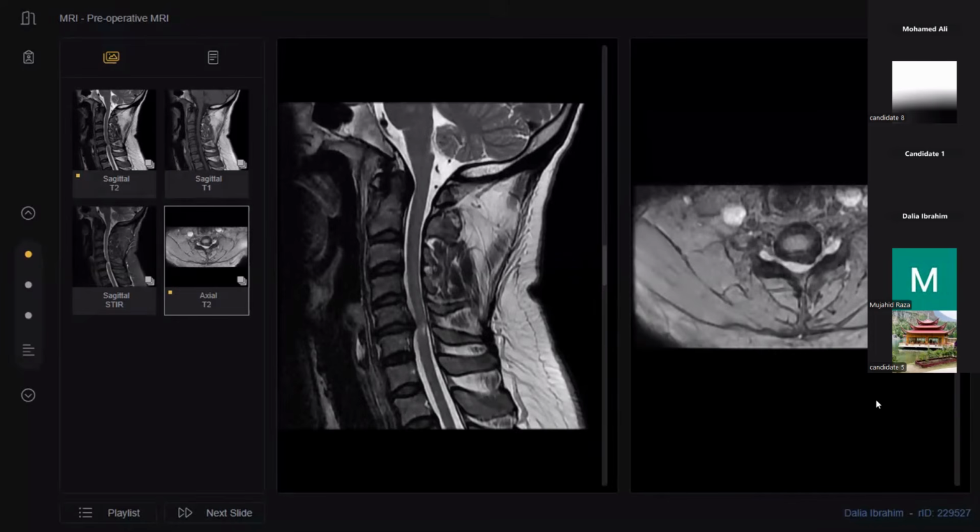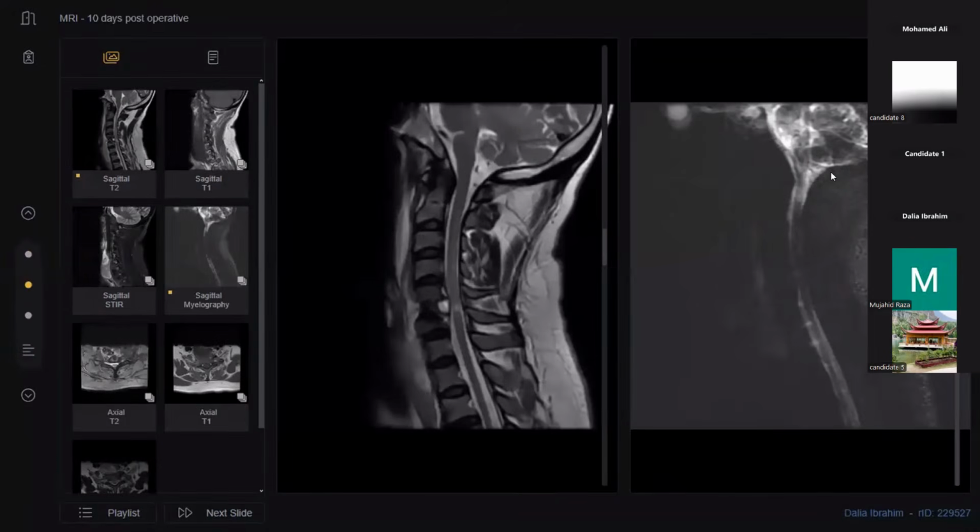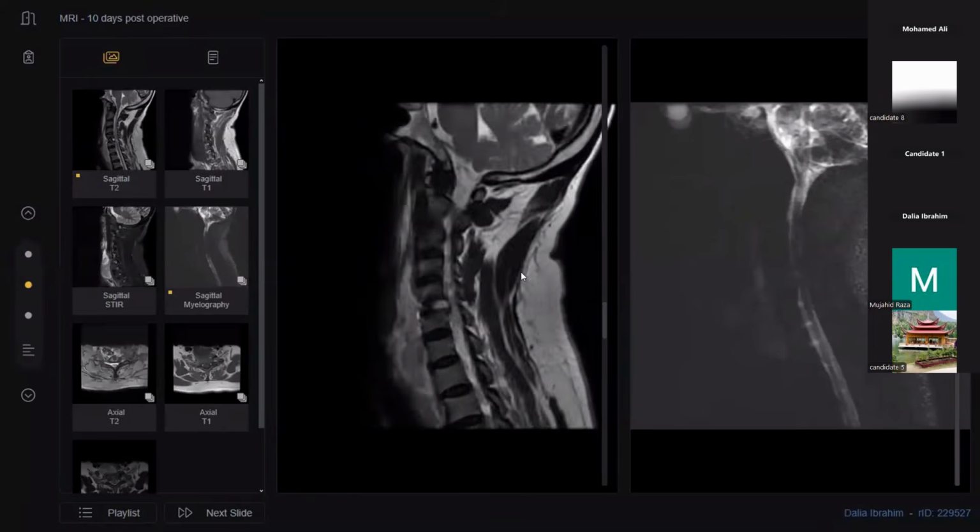Okay. I will inform the findings to the referring physician, and this would require a spinal surgical review for decompressive surgery. Yes, you are amazing, Sadish. Your description is amazing, and your thought of referral for surgical consultation for decompression surgery is amazing also. Okay, thank you. We will continue with this patient. Can you continue, candidate number 8, in this case also? Okay, if you want to share.